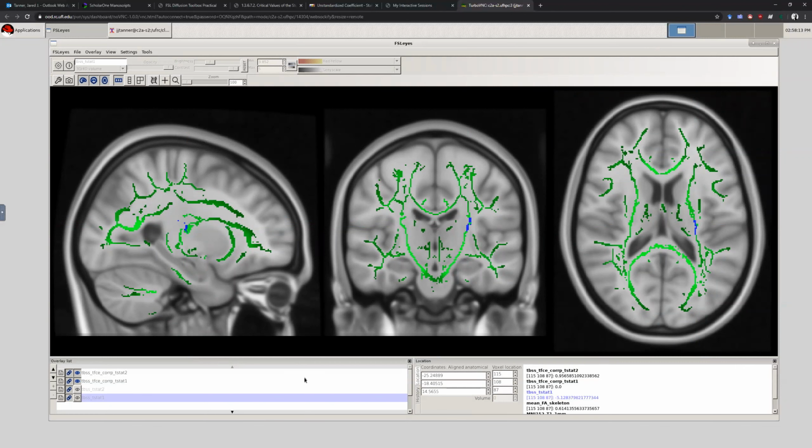So we will end there. That was our example of loading in TBSS results to look at them. And there are more things you could do with these data, kind of beyond what we've done. But for the most part, a lot of TBSS analyses is you want this visual. And then we would comment and we would say, okay, so where are these?